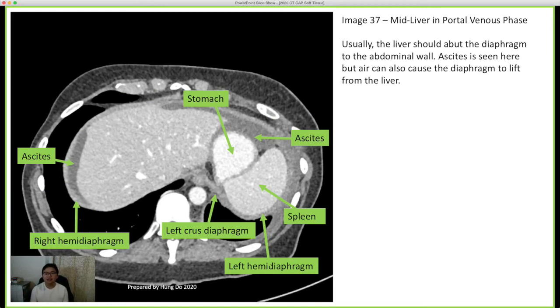So in the initial stages of the arterial scan, the spleen is going to be flooded with contrast, and it has that wave-like mottled appearance. But now in this phase, it's stabilized. The spleen has a very nice homogeneous appearance, and it has this really nice shape, which is very normal. Sometimes you might see a splenic cyst, a liver cyst, etc. as well, which should appear as a nice black fluid-filled structure.